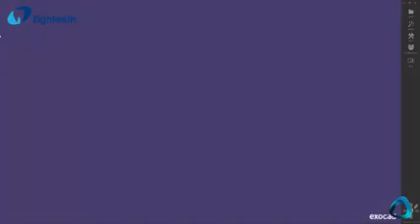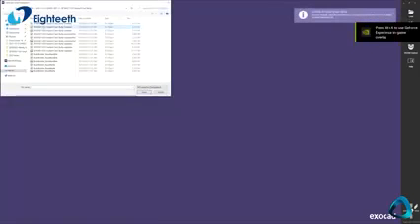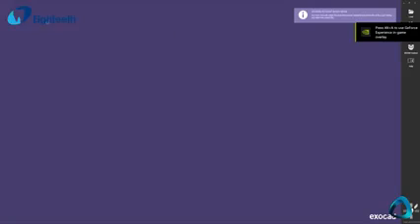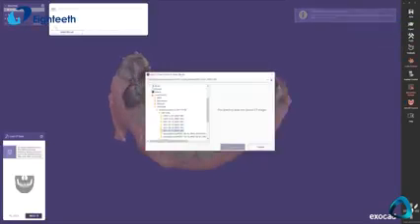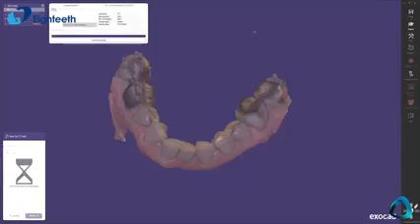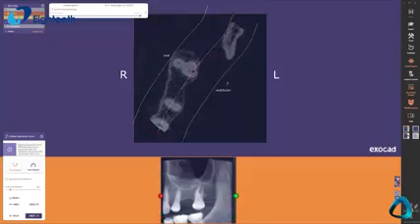You can use literally any surgical guide software, and there are plenty of options on the market like Blue Sky Plan, 3Shape Implant Studio, or Exoplan by Exocad. In this particular video, I'm going to show you the Exoplan workflow. When using Exocad, we will import our CBCT data in DICOM format and follow their workflow. This involves defining the panoramic curve, as you can see here.